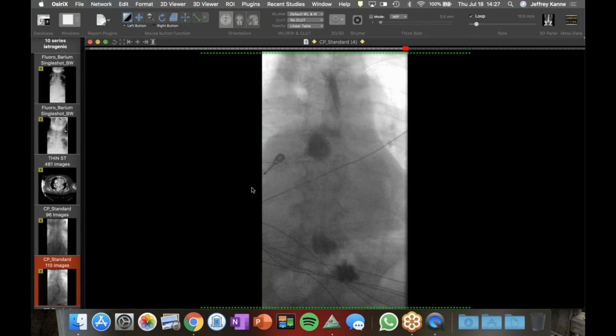And so it wasn't until we found, and I don't have the outside old CT, but there was an old CT from a few months before that showed no diverticulum. So what had happened is this is a perforated esophagus, but it formed because when they do the mediastinoscopy, they take out the whole packet of lymph nodes. It leaves a space in that region. So it created a space for the contrast to pull and then pool.